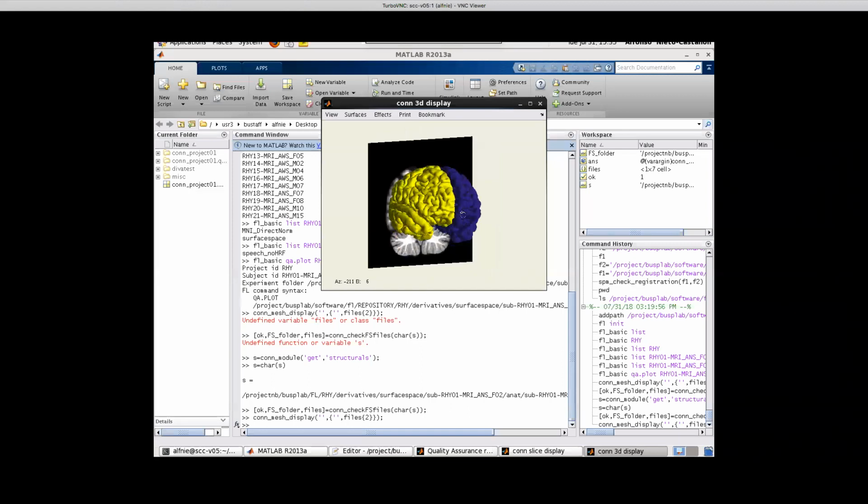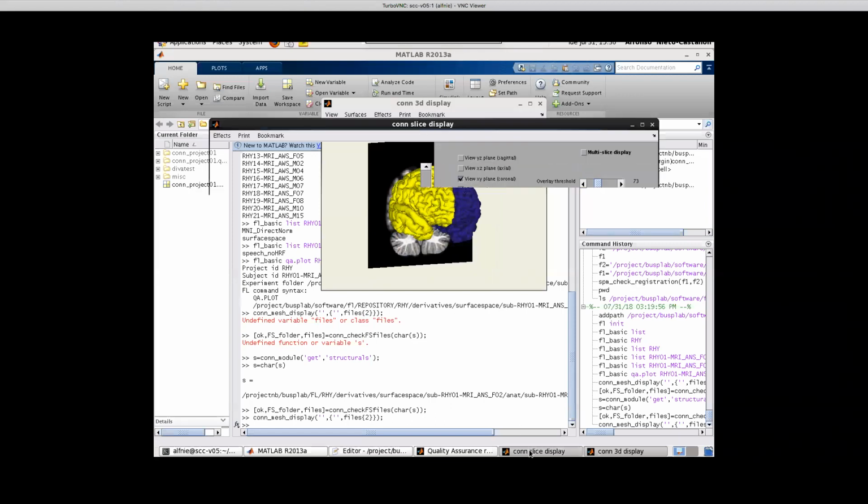Would you want to have anything projected on the surface of this data? I mean, looking at the three-dimensional look of those subject-specific surfaces generated by FreeSurfer, is that useful as a quality assurance plot or not, in addition to the other plots that we are talking about generating? That's what I'm not totally sure whether we actually need or not. Or projecting the activation on these surfaces instead of doing it on the FS average volume that I'm displaying right now. So the latter, I think, would be very handy.